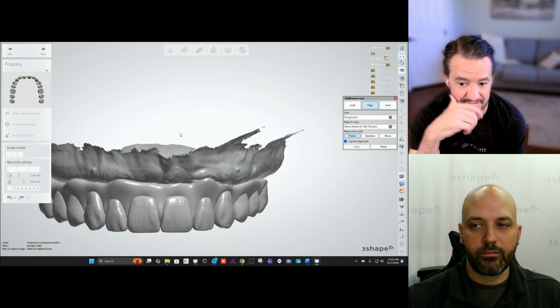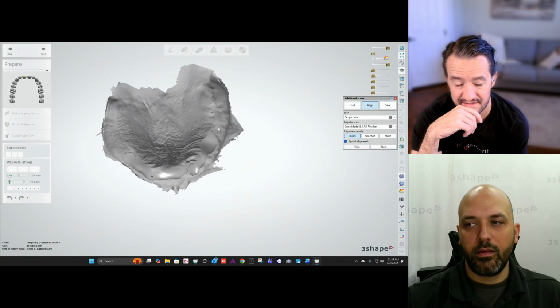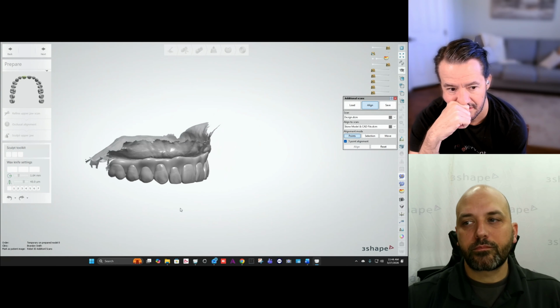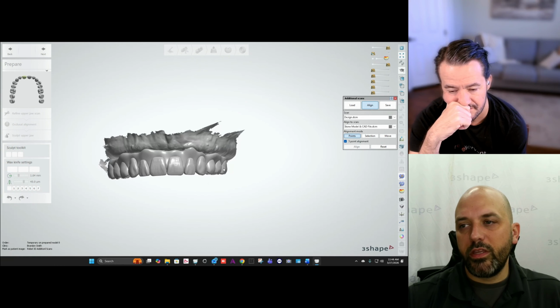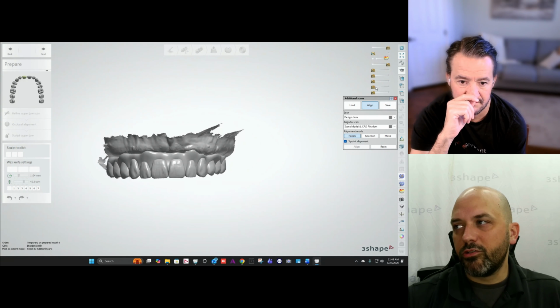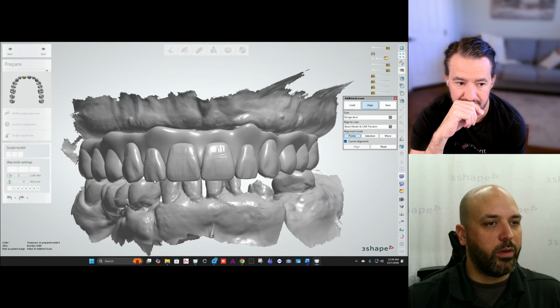And so now you're just going to recut the implant interfaces into this design, basically, and adapt the tissue. I'll adapt the tissue, fix the tooth positions a little bit, and then I'll be able to reprint this. Most of the time when you do these alignments, you don't have as much of a bite discrepancy as I have here, because it's usually not the bite that's wrong, it's the position of the implants that ends up wrong. So you can see I'm kind of open here, so I'll have to do a little bit more adaptation.